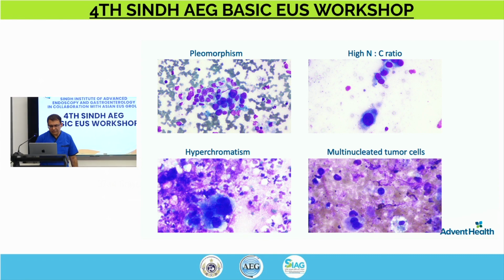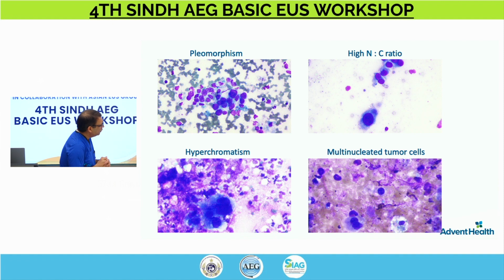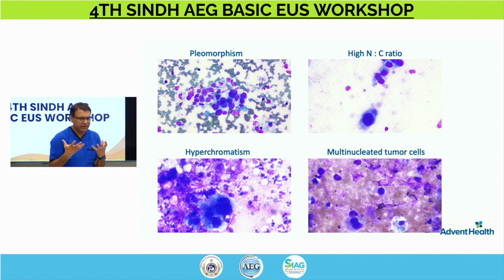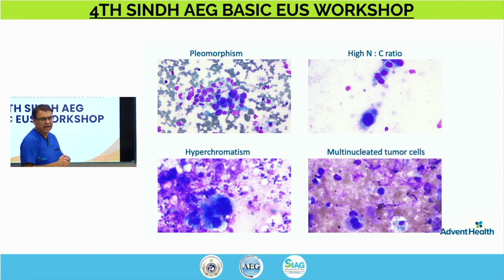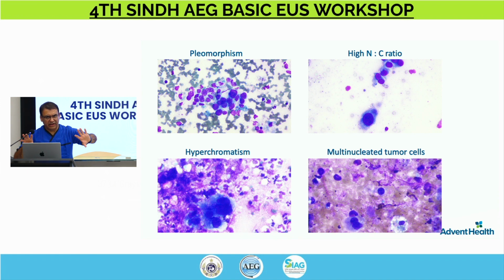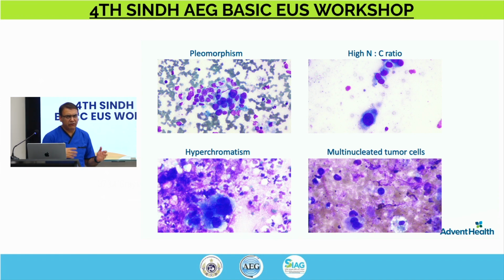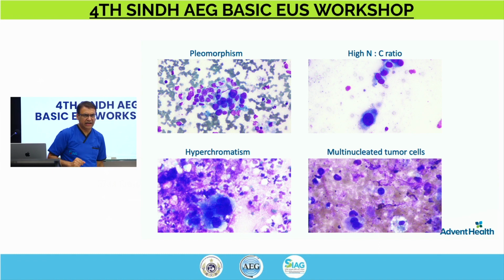Okay. And then this thing we call a multinucleated tumor cell. You literally see the mitosis in here. They're like 2 nuclei together, separating from each other. They're not macrophages. The first one was the macrophages, which can look big.